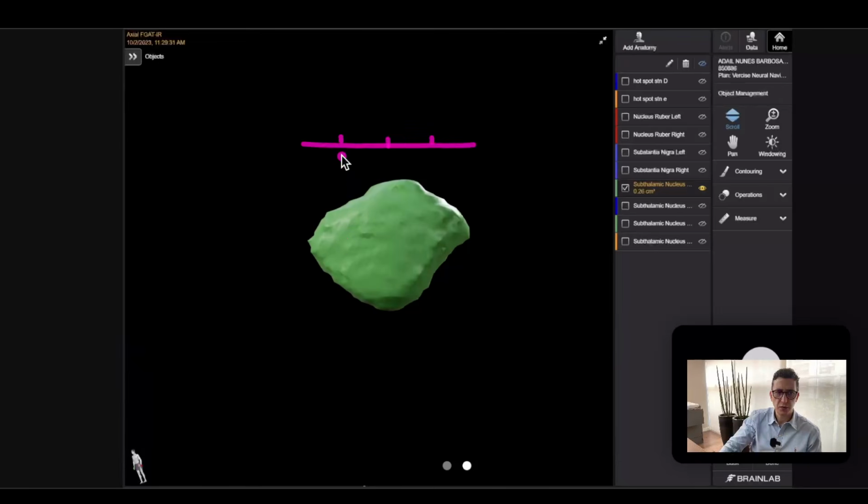And then I'm going to draw this line like this in the first quarter here, and then I'm going to get this first quarter from the right, and then we are going to go in the bottom of the nucleus, and then I have this point here. So this is a good marker. You are not going to see this in the literature because I made this by myself. You know, I got all the studies that analyze the hotspot in the STN to do that.